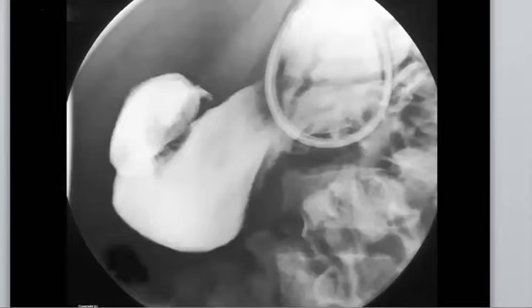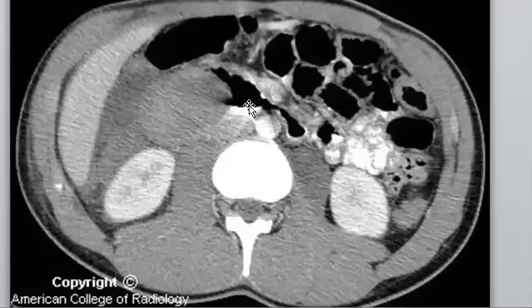So another case. They mentioned that, if you follow the stomach and the antrum, then what happened here? There is something here, which part should be here? Yeah, the duodenum, perfect, Marwa. So I will go and see what in the CT could be here. So this is what is called intramural hematoma. Yes, intramural hematoma.